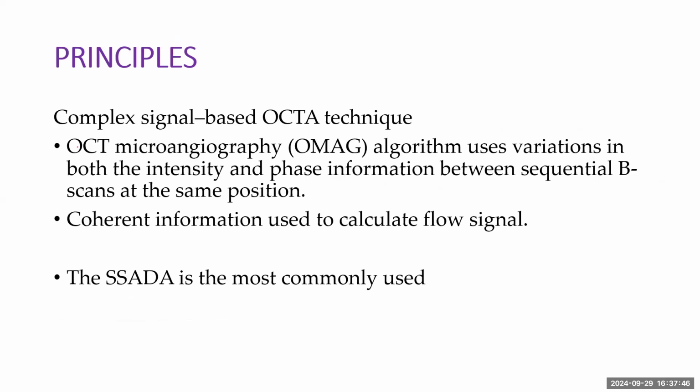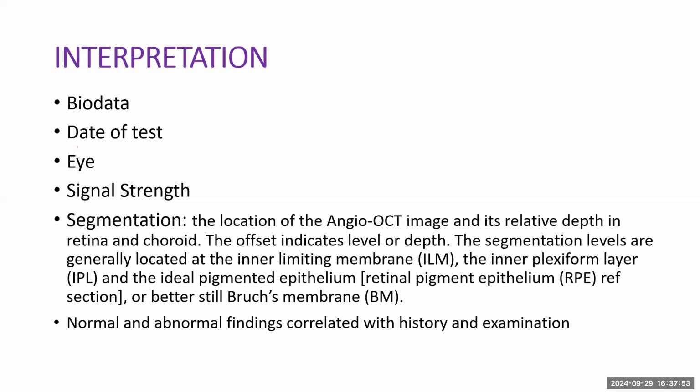There are other systems like the microangiography system, but this SSADA is the most commonly used. So for the interpretation of the results, we still have to go through all this: the biodata, the date of the test. Biodata is more like the patient, the age of the patient, the eye of the patient. In some places, they make room for presumptive or pre-test diagnosis. Signal strength, segmentation.